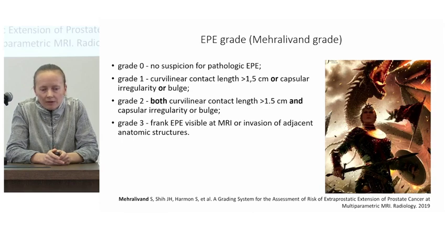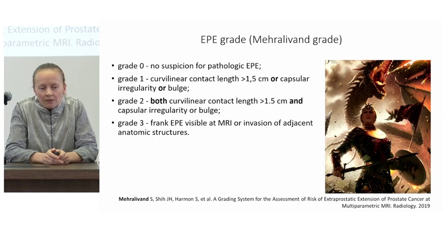The next one is the EPE grade, or Mehralivand grade, named by the author. And this is already a grading system.